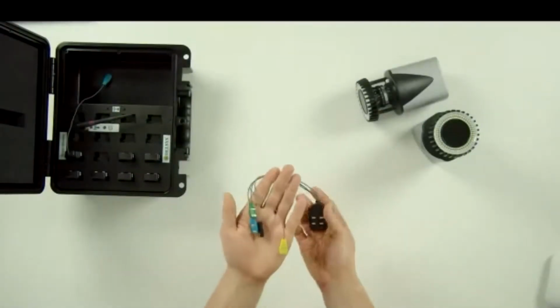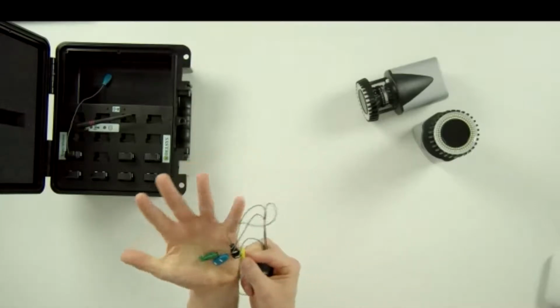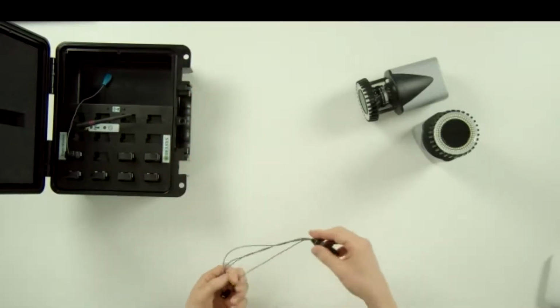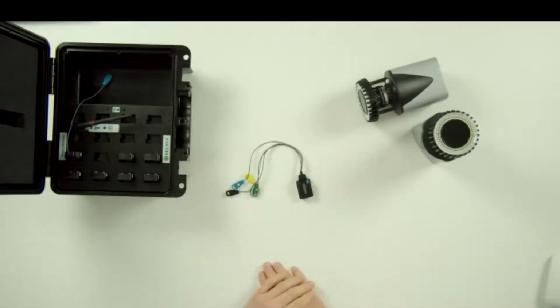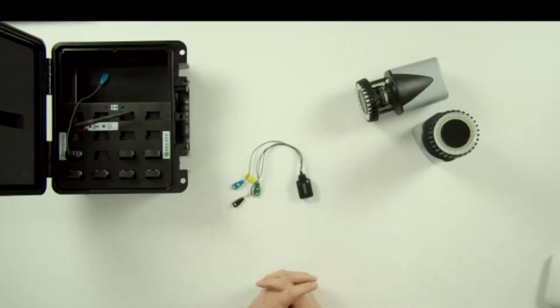the Trigno Quattro sensor, where these very small miniature heads can get into the interosseous muscles of your fingers, or look at very small, delicate movements of your finger or your wrist by measuring the forearm muscles. In the same vein, we could do this in the neck or the face. We could study human emotion, or we could look at the intrinsic muscles of the foot, and lots of other types of similar applications. And so hopefully today has demonstrated this rather unique application.